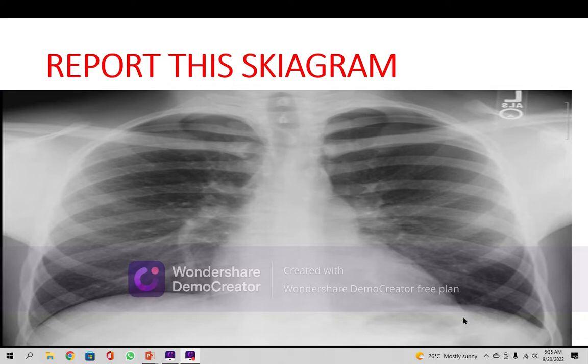The spaces are normal. This is the scapulae posteriorly, and the lateral margin is outside. It should not be inside. The spine. So this is the cervical spine above, and then the thoracic spine is not in one line. It's moving like this. I already said it is in kyphoscoliotic position. Scoliosis is clearly visible in this patient. These are the bony skeleton. It's a summary of it, I would say.